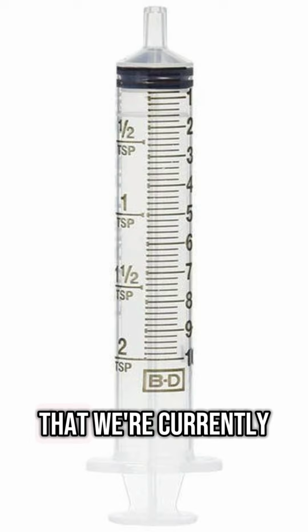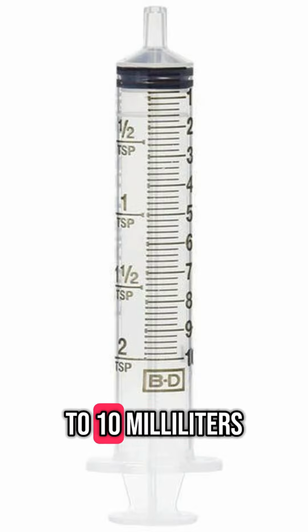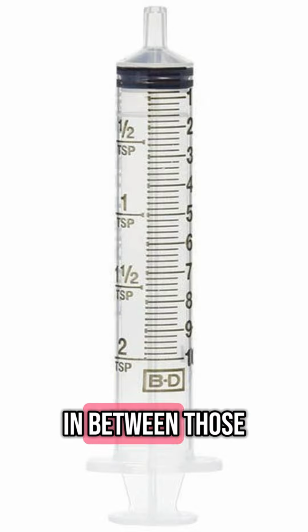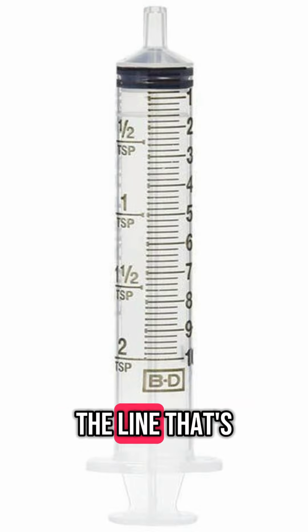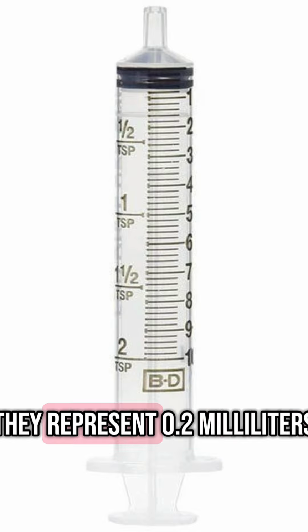For the syringe that we're currently looking at, this is a 10 milliliter syringe, meaning that you can draw up to 10 milliliters of a solution in this syringe. Now, don't forget the lines in between those big numbers because they matter as well. For this particular syringe, the lines in between the big numbers represent 0.2 milliliters.